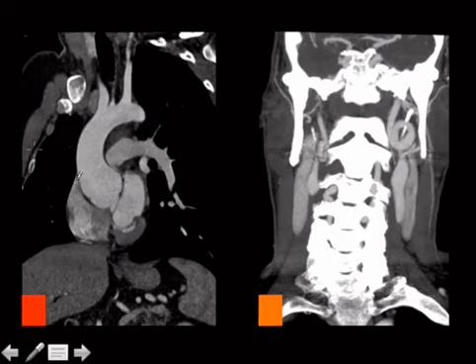So like this part here is bigger than that part here. It's usually the other way around when you see aortic aneurysms. And this is an Aunt Minnie from Marfan's, which you may remember is a defect in the fibrillin gene, which is part of how your collagen works.